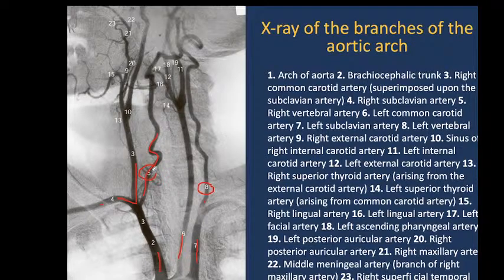They pass through the cervical vertebrae and come together, join in the brain cavity, and form the basilar artery here, which transports the blood to the posterior parts of the brain, like the cerebellum and occipital lobes of the human brain.